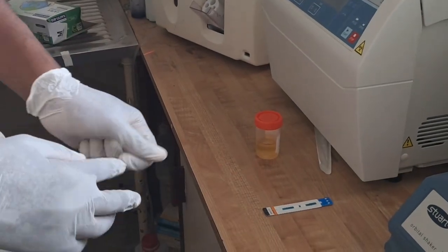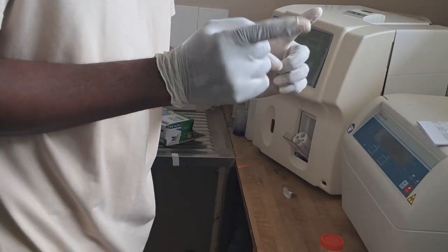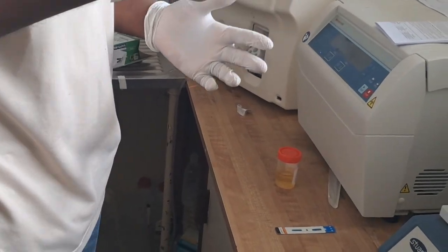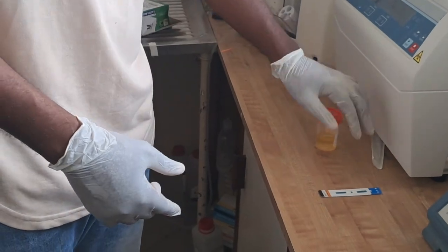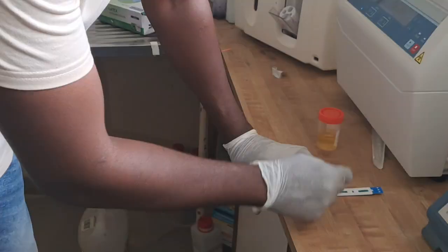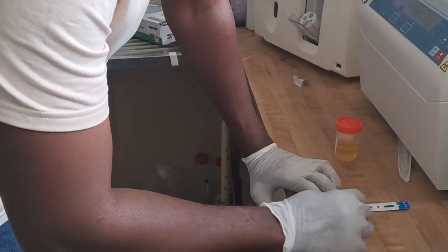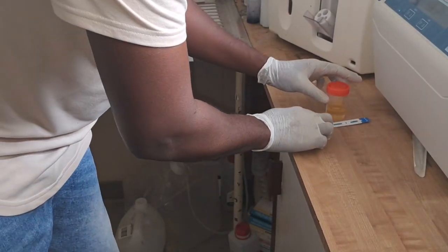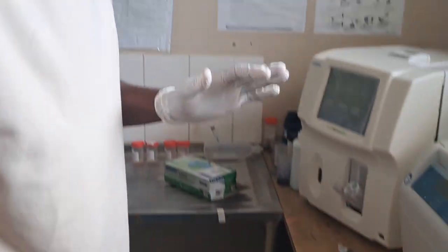So this is our test. If you are doing more than 3-4 tests, you label them to avoid cross-matching of results. If it is like Madam Kunda, you put Kunda to match the sample. If you have another sample, you do the same, just like that.